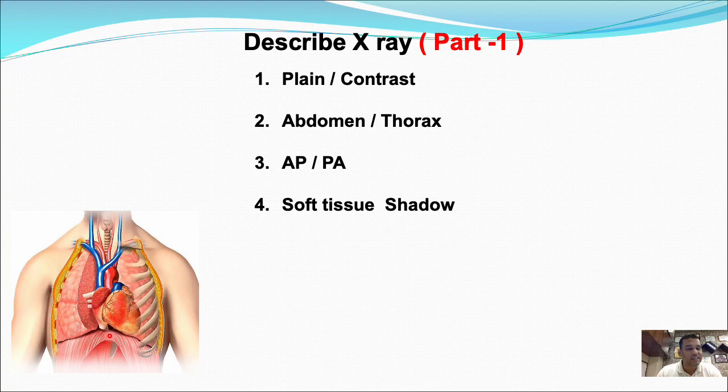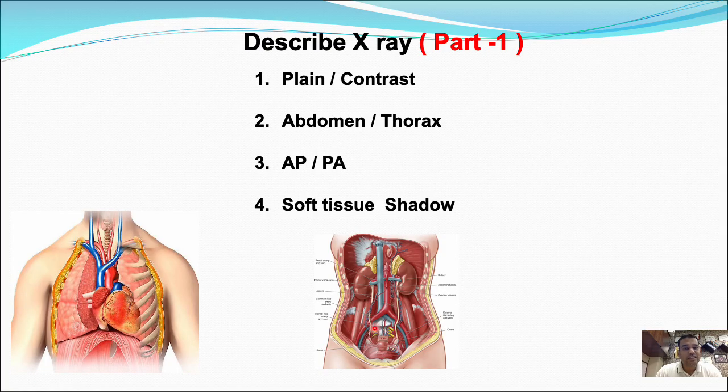So when you are given an X-ray of the chest, you should try to imagine this normal anatomy. Next are the organs in the retroperitoneum. This is the right kidney, slightly lower compared to the left kidney. These are the adrenals, and these are the ureters that run parallel to the transverse processes, and at the sacroiliac joint they slightly go out and then turn medially to enter the bladder. So you can see the structures.